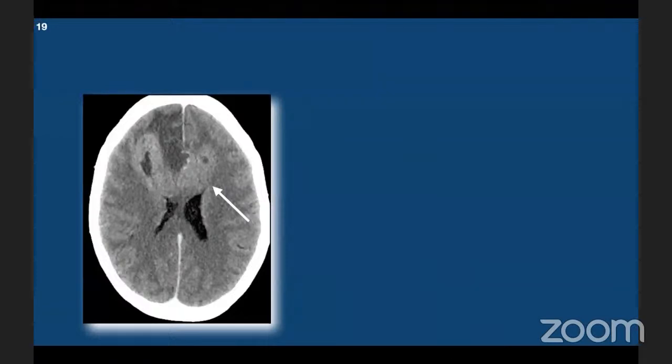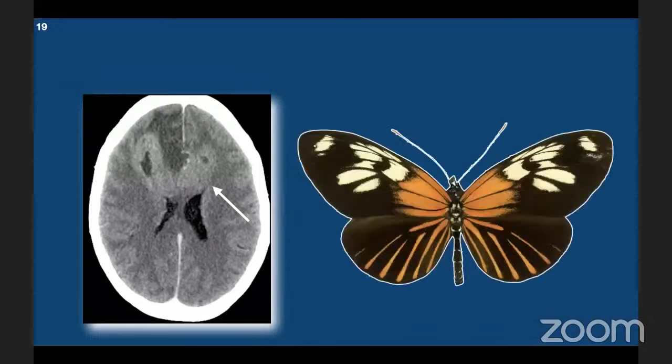This CT scan shows bilateral intraparenchymal space occupying lesion. It has both solid and cystic component. The lesion is involving the genu of the corpus callosum, and it causes extrinsic compression on the ventricular system. Based on the configuration of the lesion, it has been described as a butterfly lesion. Butterfly sign typically contraindicates the surgical option of the tumor.